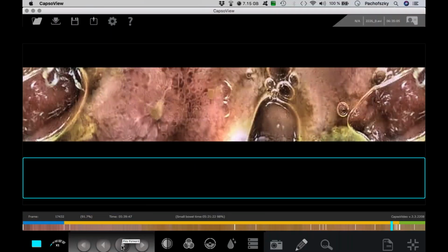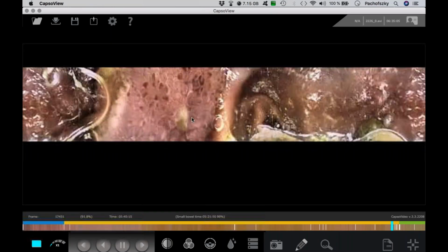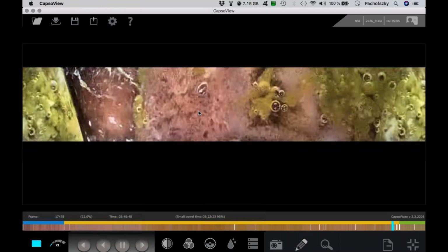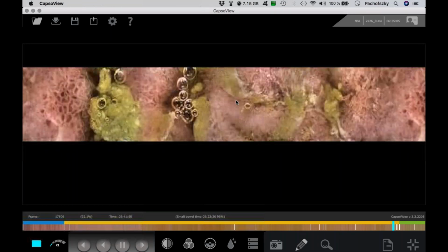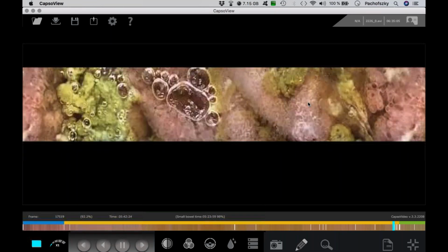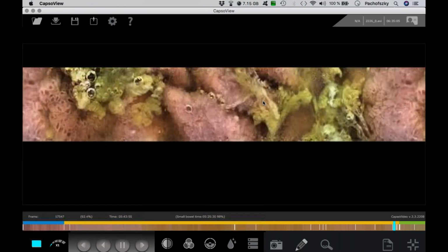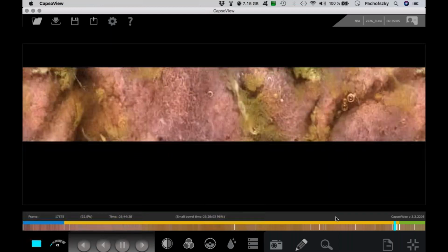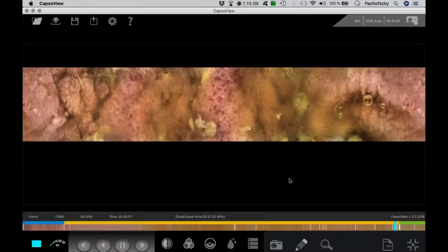But maybe you will think it's looking like the Crohn's disease of before, but this is an NSAID enteropathy. She had a problem with her knee, and she's swallowing a lot of NSAIDs, and that's what it looks like, an NSAID enteropathy. And all those lesions you can see are the cause of the gastrointestinal bleeding.